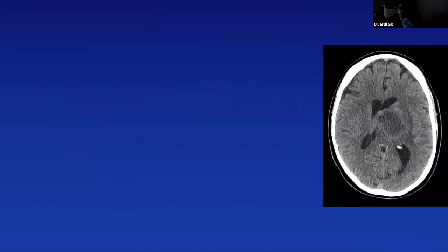Now we're going to talk about a different kind of lesion, and these are a little more concerning. Everyone can appreciate here that you have a somewhat well circumscribed lesion to the left of midline, which internally shows decreased attenuation, not fluid density, but less than parenchyma, less than expected white matter, gray matter, with a ring around it of increased attenuation, so almost a capsule formation.